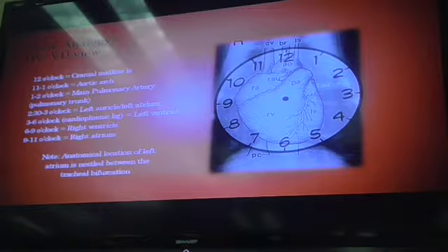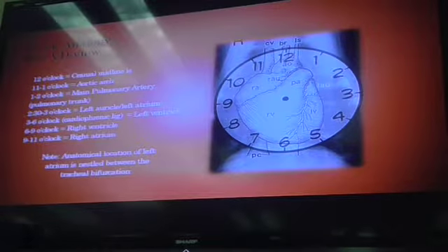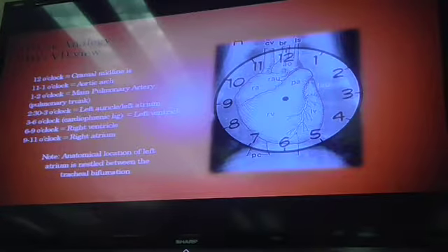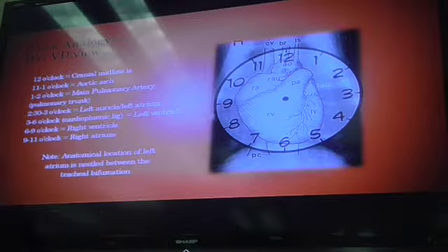All right? And then I say, well, there's a bulge from the 6 to 9 o'clock position. That's typically indicative of right ventricular enlargement. So I think this dog has a more progressed state of heartworm disease. Now you should see that inverted D. I gave you guys some insight. All right? So that's how we use the clock analogy to further identify what's causing that cardiomegaly.